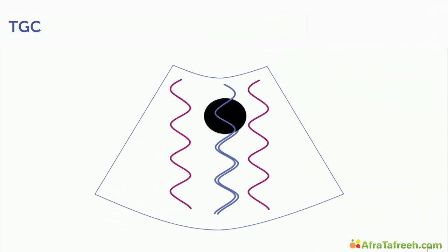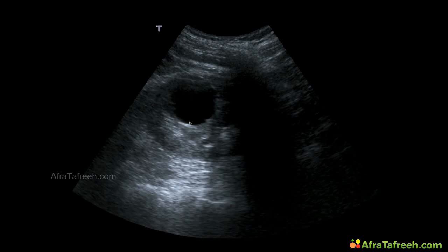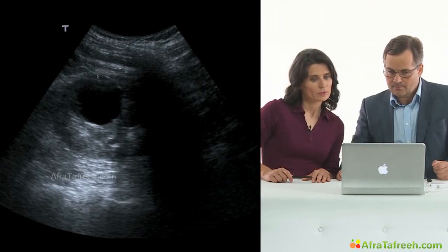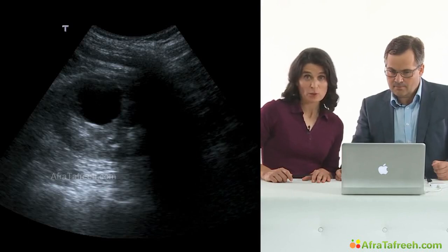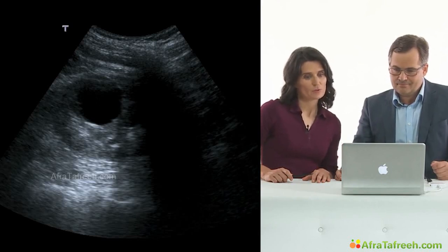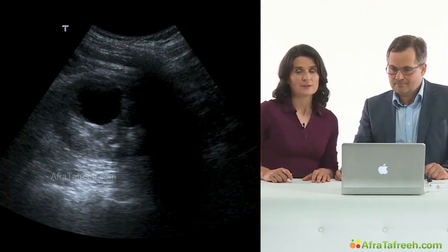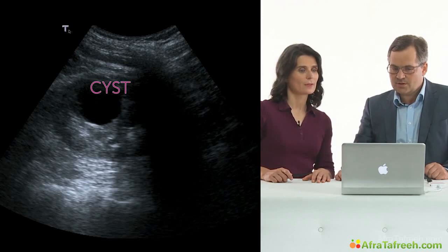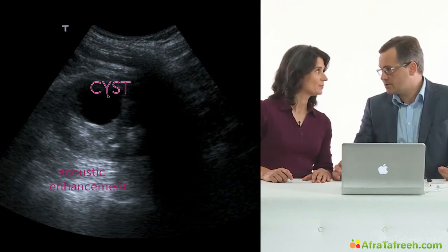Let's see the next example. In this picture, we can see a renal cyst. We can see this round structure, filled with fluid. The content of it is black. And the fluid is a less attenuating material. We already know that. And so behind the cyst, dorsal of the cyst, we see an enhancement over here. The ultrasound beam is enhanced, and in comparison to the surrounding structures, it is a lot brighter, like the beam of a flashlight. So we can use this artifact to diagnose cystic lesions.